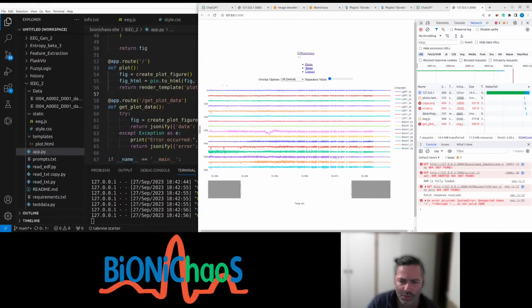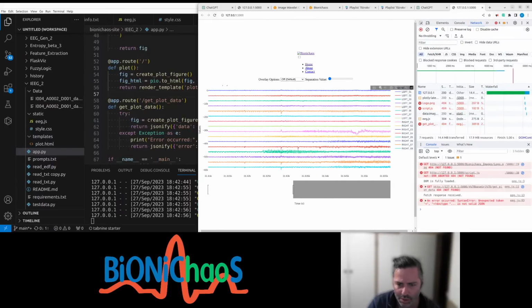So this is actually a seizure in EEG. It's a 16 channel EEG. We have a seizure in it. It's pretty straightforward, and it starts on that right side of the brain, probably. You really need a neurologist, epileptologist, someone to look at it.